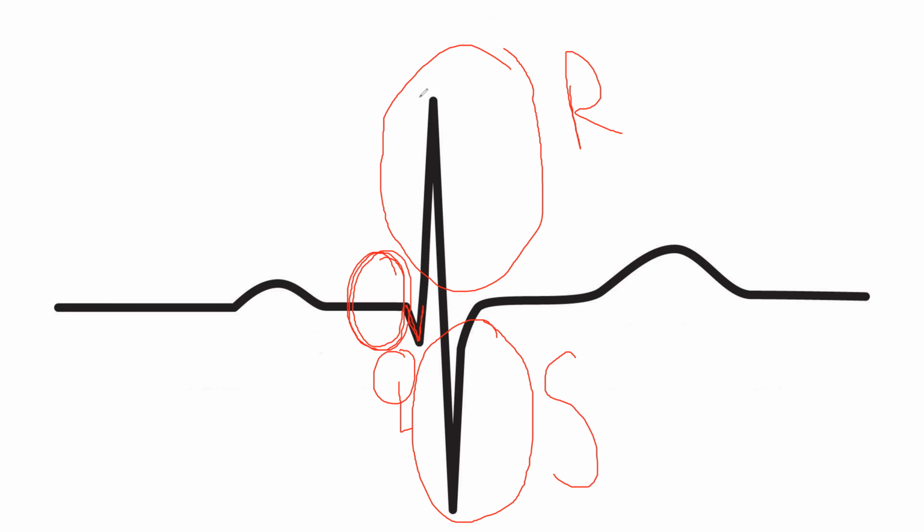Please note that whenever you have an R, after that you will never, ever have a Q wave. Okay? So these are nomenclature rules that are by definition set all over the world. So it's very conventional. If you have an R wave, you never have a Q wave after that. Okay. Additional steps, which are really very important, will help you read any QRS complex. First step is, if the entire QRS complex is positive, the wave will be called R wave, simply R wave.